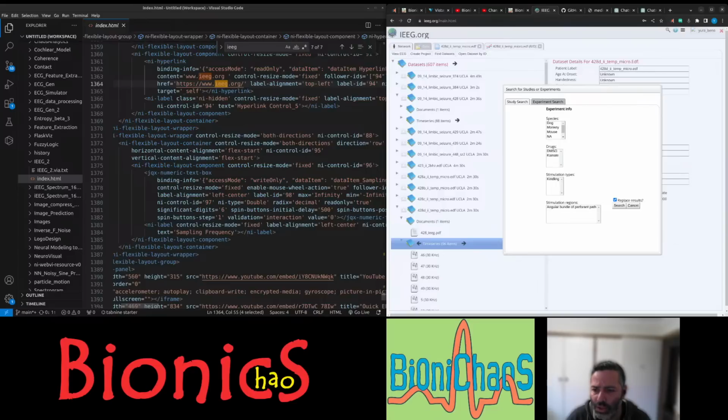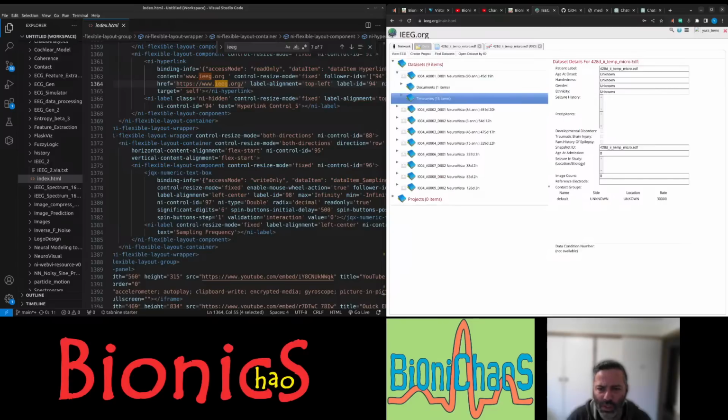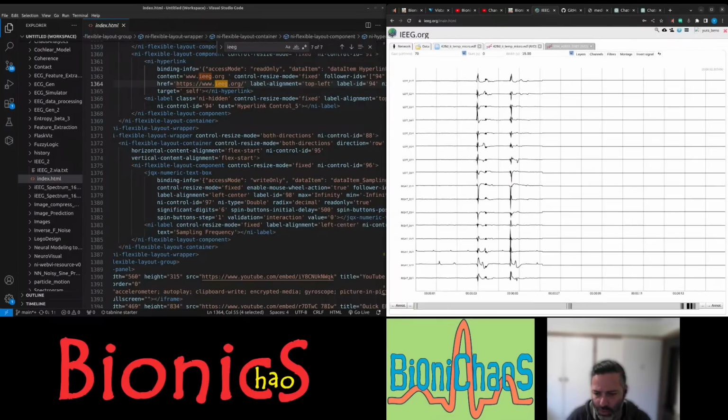Experiment search. So actually that experiment is right, that's the one. That's the one we used before. So I'm kinda familiar with this device. And also the reason I like this one is much longer. So it's long-term recordings. Just look at the first file. I think this one was loading as well. View EEG. Right, this one actually doing something. Right, so this is great. It's scrolling.